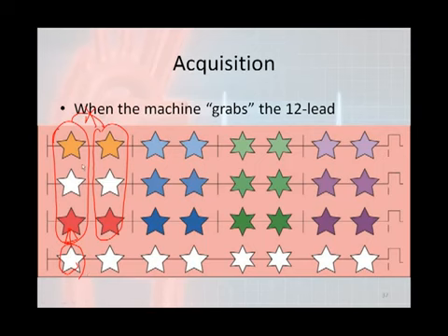This is lead 2, because here's your lead 2, and the white stars are the ones printing in lead 2. Every single complex above that one correlates, all of these correlate with each other, so do these as well, and these as well, and these as well. All of those correlate above, but you have no correlation between those right there. None of these actually correlate at all. This is the temporal relationship.